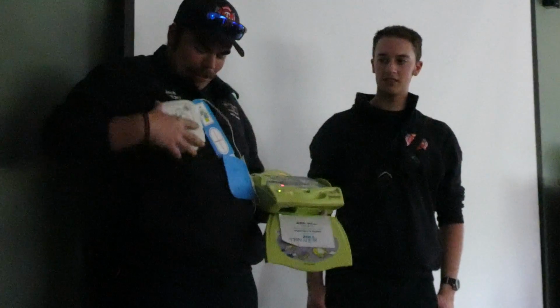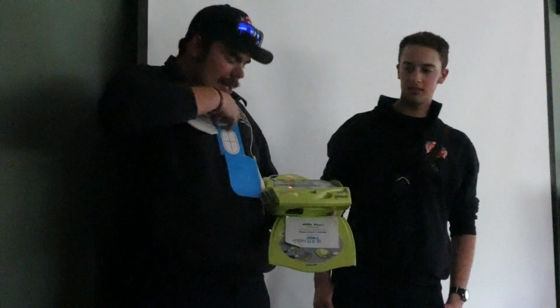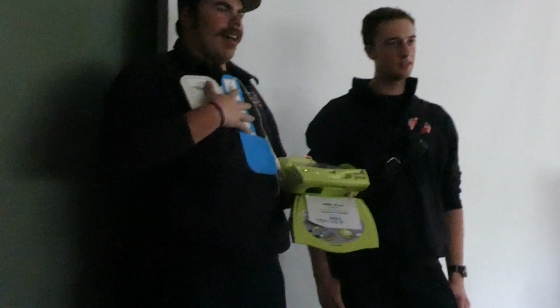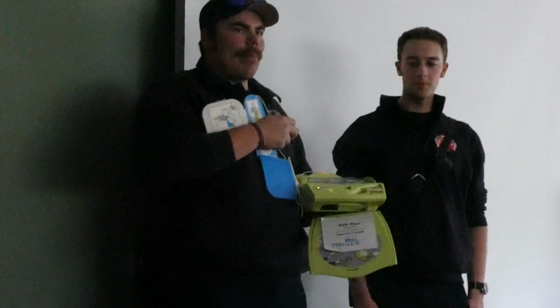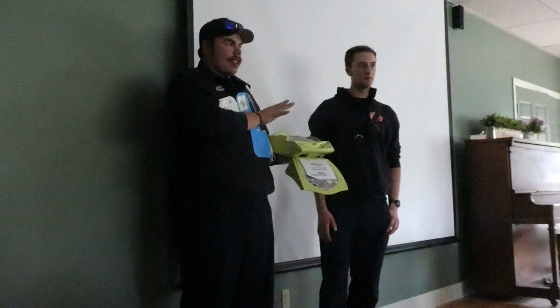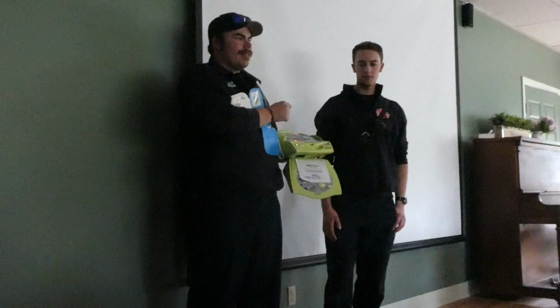You put the stickers where the stickers say to go, and it will only shock if you're in a rhythm, if the electrical activity in your heart is in a rhythm that a shock will help. So you don't worry about hurting someone. It won't shock if they don't need a shock. You can sit here all day pushing the shock button and nothing will happen if there's nothing to shock. If it tells you to shock, it'll do the countdown. Make sure no one's touching, because anything that's touching is going to get shocked too. And you push the button.